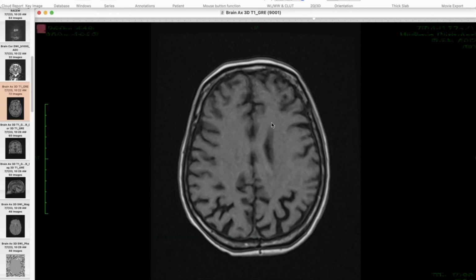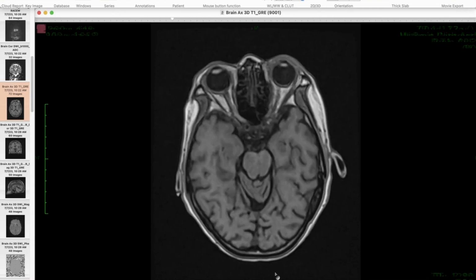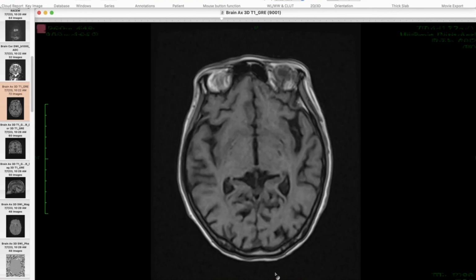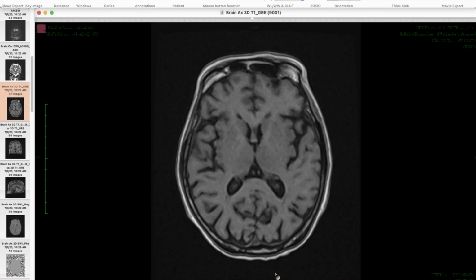In certain variants of Alzheimer's disease, you also see some atrophy of the frontal lobes, the parietal lobes, and further down, the occipital lobes. Every region can be affected in different diseases, but that's just a gross overview of what we're looking at. And again, I mentioned before, E-anatomy is a fantastic resource if you're interested in diving deeper into anatomy.